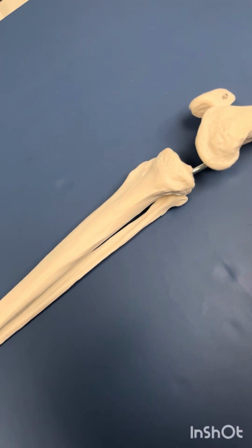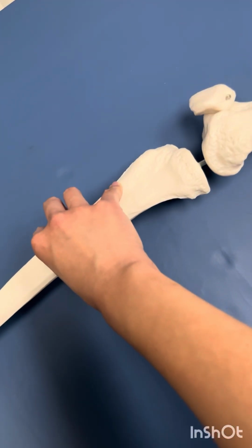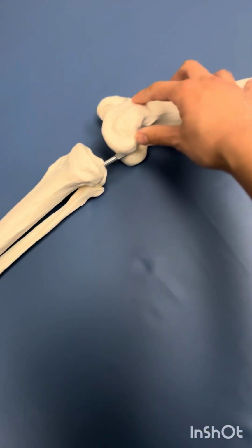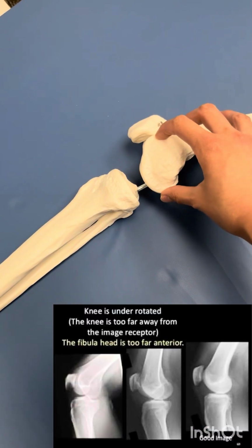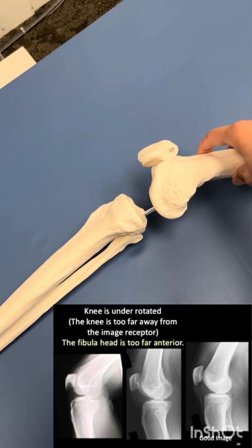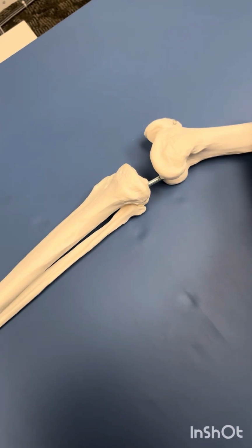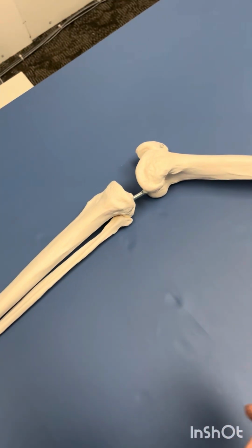If the medial anatomy is more posterior than it should be, it makes the fibula be superimposed over the tibia. And if it has the medial condyle more posterior, then that means that the knee is too much off the table. It's too medially rotated, and basically you just need to rotate the knee more laterally towards the table. All of these examples are if you were doing it tabletop, not cross table.